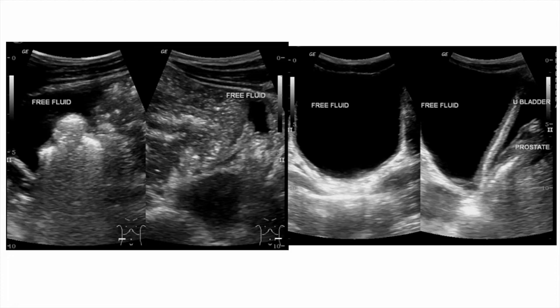You can see this large amount of free fluid in the intra-abdominal cavity. So when you request an ultrasound, you will receive a report with this large amount of fluid, in the majority of cases with septations. When you receive this, depending on the clinical history of the patient and the lab test, you can almost be sure you are in the presence of intraperitoneal tuberculosis. It's very important to know.